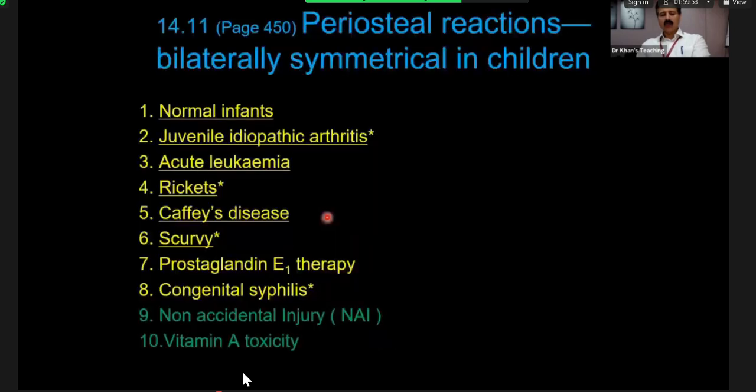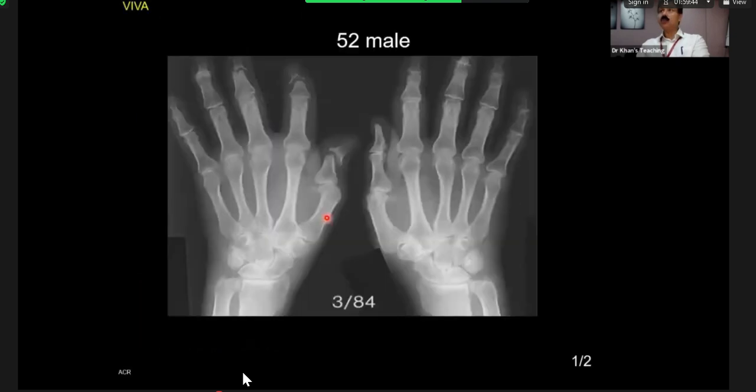So we will now, candidate 2, I'll give you one more film, which is this film, and then we will take a 5-minute break. Candidate 2.